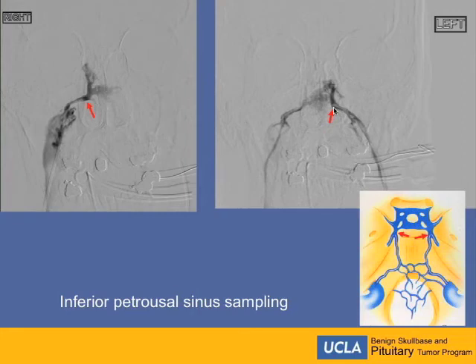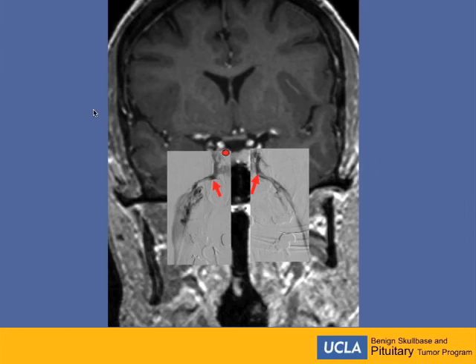First of all, the inferior petrosal sinus can be hypoplastic in many cases, and there are some basilar communications, etc., and all these plexuses can be formed in a more precocious way. So sometimes the venous sampling report is going to be the same, but the location of the tip may be down here, and you can advance higher than this. If the tip of the catheter is close enough and in a symmetrical position, this is a relatively reliable setting. This is the superposition of the tip of the catheter in this location, here the cavernous sinus, and then the suspected mass is here.